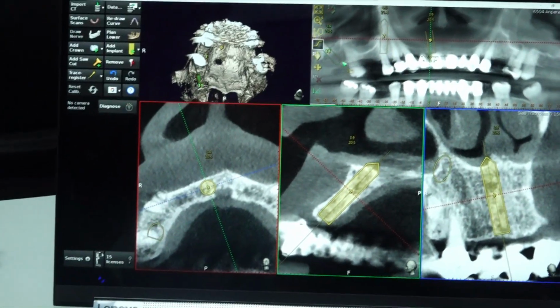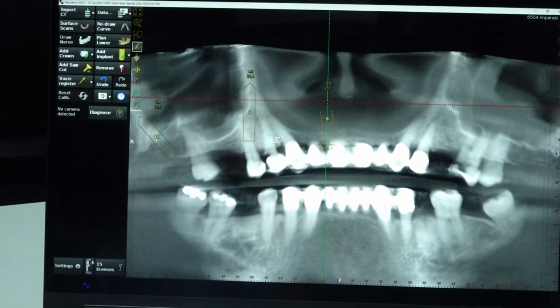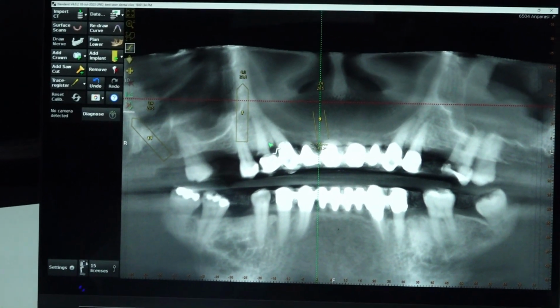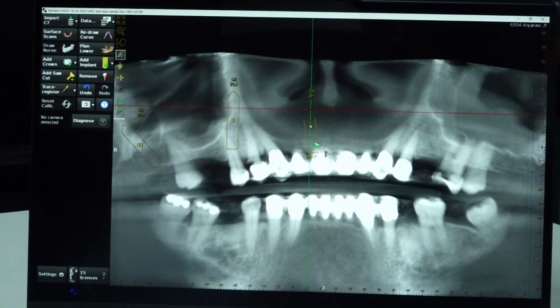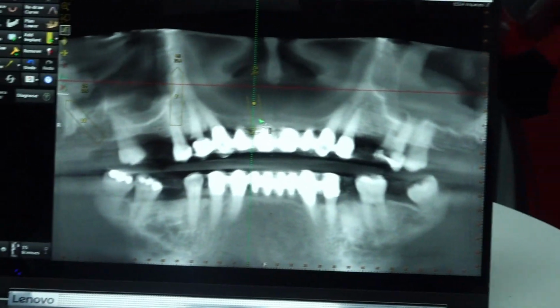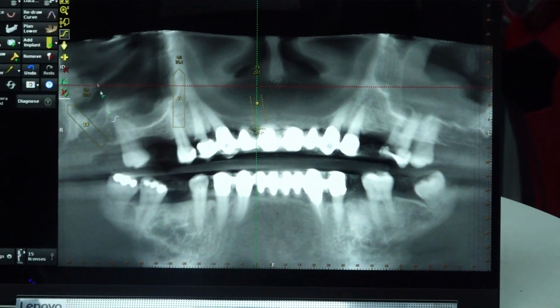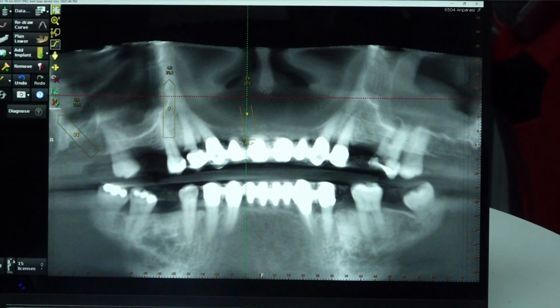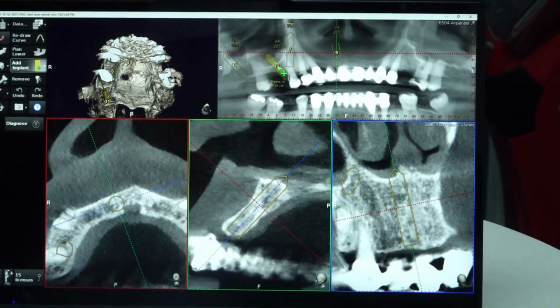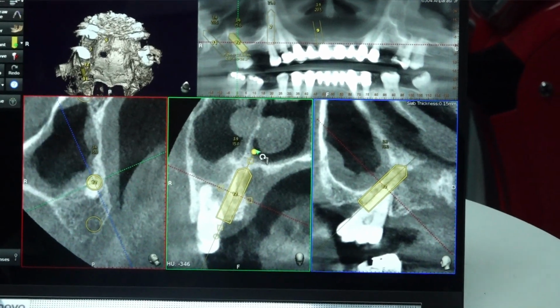Or what you can do is place this implant tilted, place another premolar implant tilted, place one implant short. Do not go till the nasal floor, and give one tooth cantilever or whatever it is. In this scenario, this molar, no, this molar palatal socket looks good.